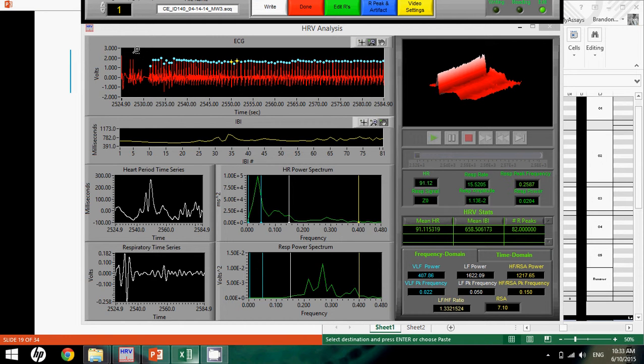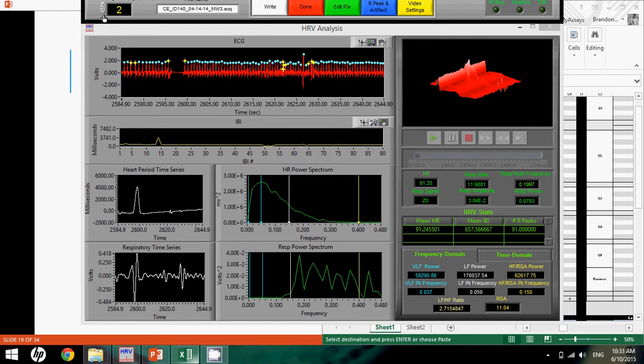And in case not everybody is using the same logic to do the analyses, you'll be able to diagnose which circumstances are a little bit more unusual compared to others. These are very rare instances, and I chose this one particularly because it is a little bit confusing. However, it's pretty straightforward that the first R spike diagnoses the valid data afterwards. So we can go ahead and move to the next segment.